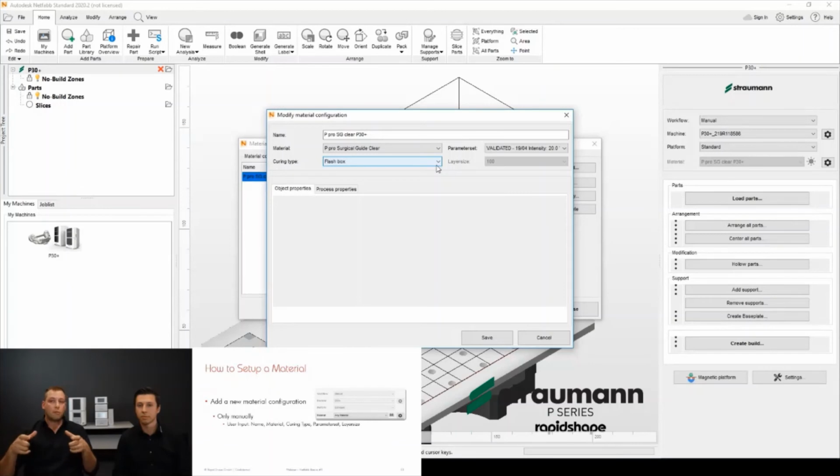It is purely about the shape that we're looking at. Okay. Yeah. So the printing time won't be affected. Short answer, it's just shrinkage, yeah. Yes. So the shrinkage is just being adjusted. Okay. So I'll just set that and close that.